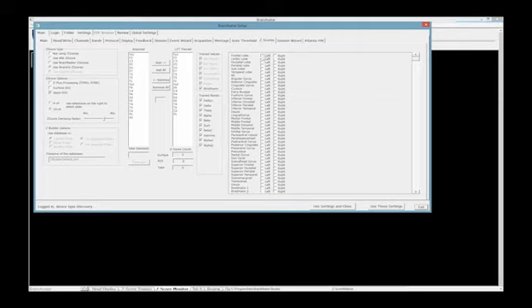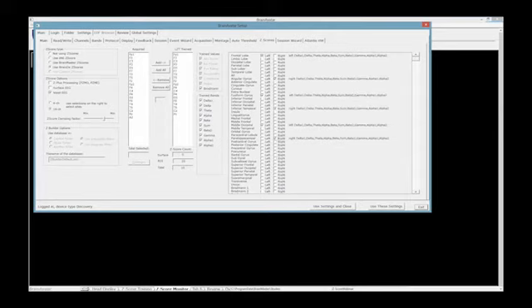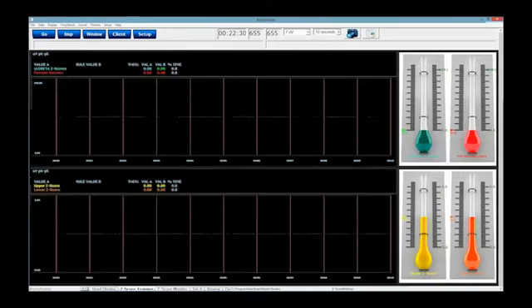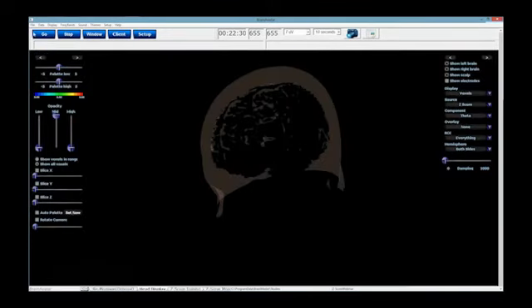So to see things that are going on with this, let's select a couple ROIs. I'm not going to go too in-depth on my choices or anything like that. I'm just going to choose a couple of them. We got 60 ROIs. I'm going to hit Use These Settings and Close. So now you're going to see on this list right here, they're displayed now, where before it was empty because we didn't have any selected. Now that we've selected them, we're going to be able to do what we want. But I'm also going to now go File, Open EEG File.